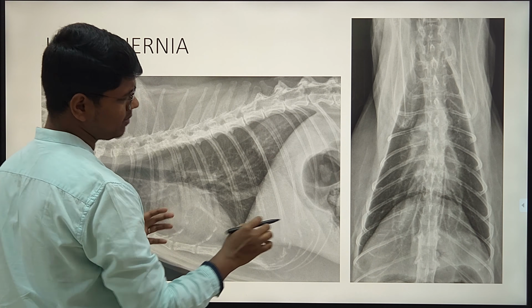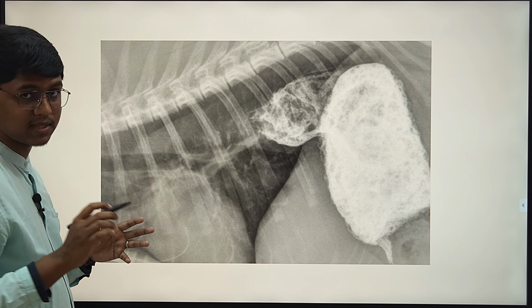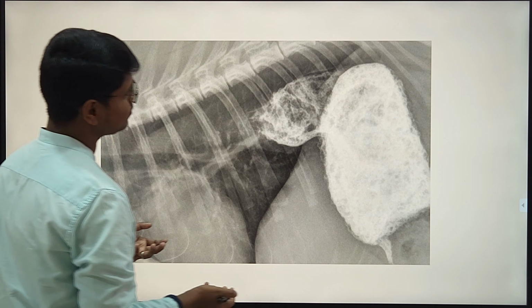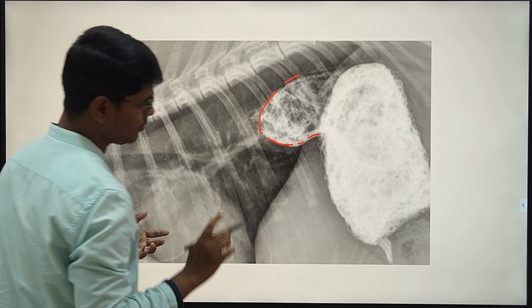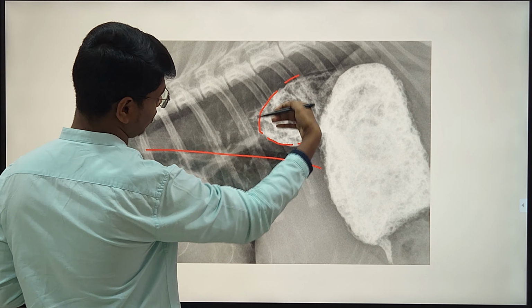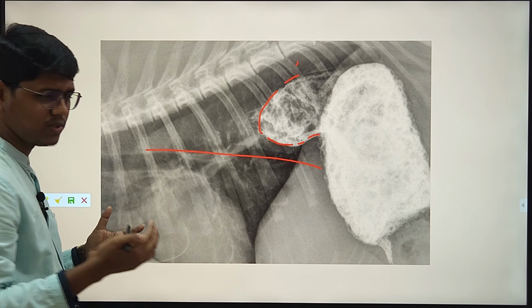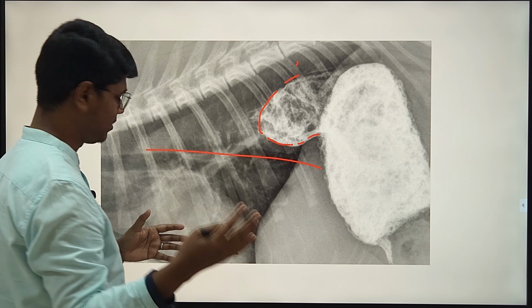I have discussed the stomach very vividly in the class, because it is mostly a disease of the stomach and also a disease of the diaphragm. Here is the contrast. You can clearly see this, remember the position. This is the caudodorsal surface, caudodorsal of the thoracic region. When we discuss the mediastinum, we will see differentiation of the regions in the next class.